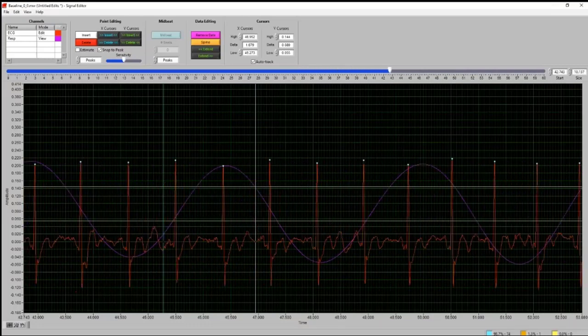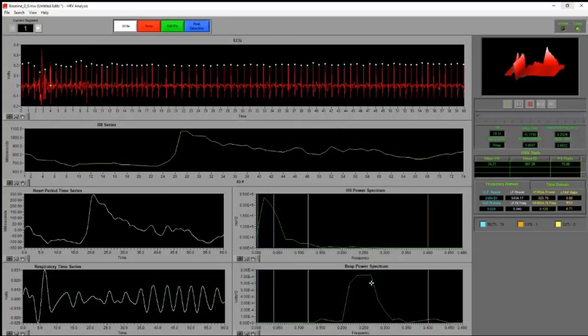And then the rest of the segment looks pretty good. So we first come in, we ensure that our peak respiration frequency was within our bands, and then we will edit the data. Again, if this peak frequency is outside, if it is higher or lower, then we likely want to not edit the segment anyway. So let's not waste our time trying to edit the ECG if we know that we can't validate it.